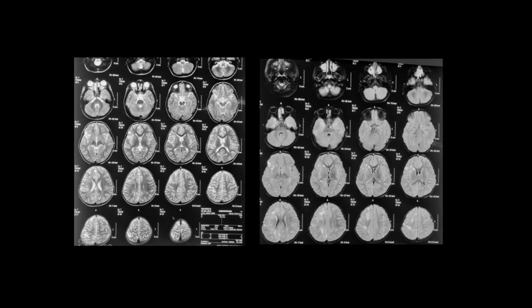Is that what you're asking? Yeah. The twin-to-twin transfusion and those sort of things occur, no? They occur, but these are not typical of a hypoxic injury. They're pretty asymmetrical. Okay. Is there diffusion restriction?